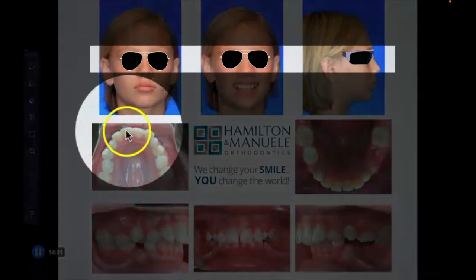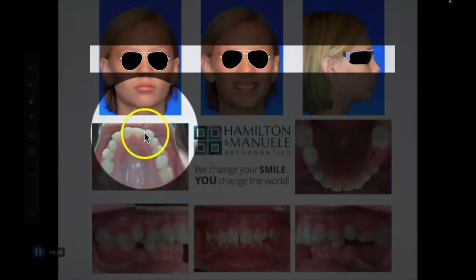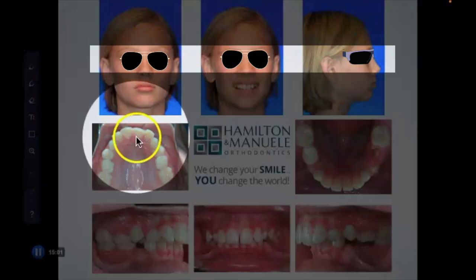And when we look at the incisors, you noted about 2 millimeters of crowding. If you look at the overlap here, there's probably a millimeter there. If you look at the overlap here, probably a millimeter there. I would agree close to 2 millimeters if we keep the angulation of the incisors where it is. Now, if we decide we're going to change the angulation of the incisors because we think it's going to look better or fit better with them more proclined or retroclined, then that affects the amount of spacing that we have, right? As we procline, we're going to gain more space, and as we retrocline, we're going to lose more space. We haven't made a definitive determination on where we want these teeth in the end, but you have to keep that in mind.